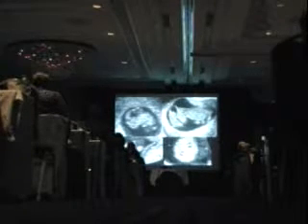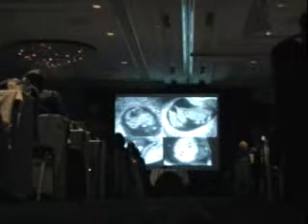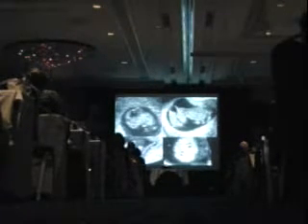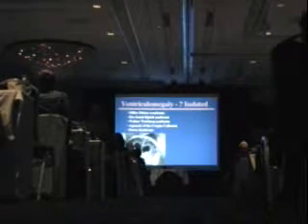So we brought this patient back at about 11 weeks. And sure enough, if you look at this image, you can see that this bump has become bigger, and the cystic area is within the bump. So this is a Dandy-Walker abnormality with an encephalocele as well. Now we know that one of the syndromes that can do this is Meckel-Gruber syndrome, which is associated with cystic kidneys and polydactyly. So I went looking for this and found, in fact, at 11 weeks that this fetus had extra digits and had these cystic kidneys. So you can nail down these diagnoses if you know what you're looking for early on, even in patients who don't have any family history.